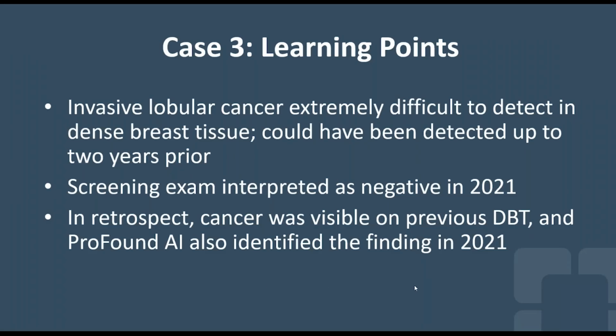So what have we learned from this case in particular? As I mentioned, this is an invasive lobular cancer, so these can be really hard to detect. I think these are some of the ones that radiologists do fear the most because they can be so infiltrative and so difficult to visualize until they reach a certain extent on the mammogram.